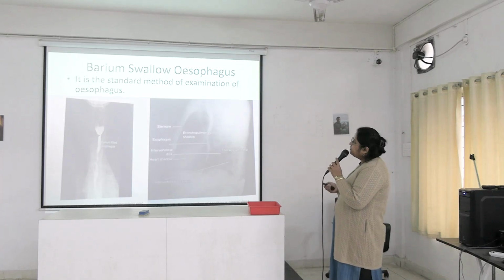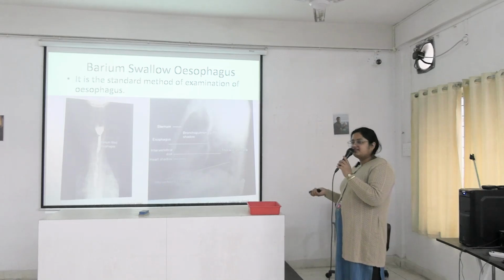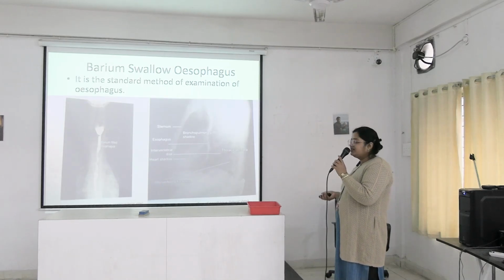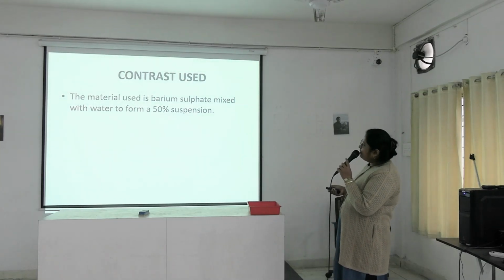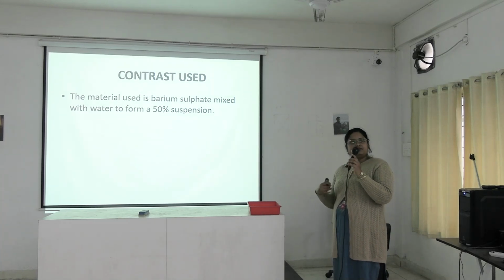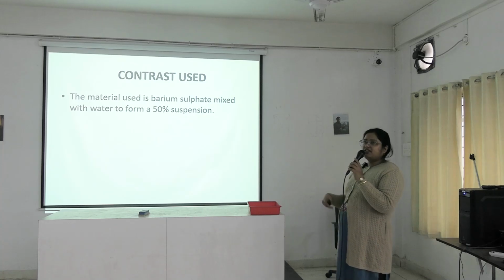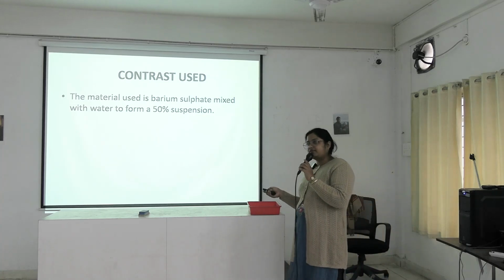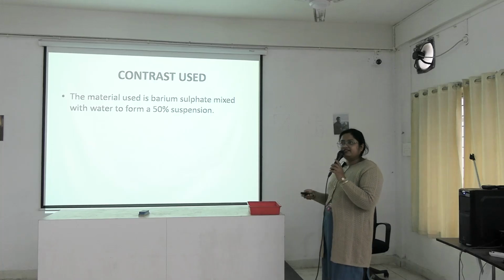Next, in barium swallow X-ray, you can visualize the esophagus in the chest X-ray. Esophagus we will discuss generally during the abdomen barium, and the contrast material used here is barium sulfate mixed with water to form a 50% suspension. The patient is asked to drink the solution and then you will take the X-ray at some intervals, like 1 minute, 3 minutes, 5 minutes. At some interval, you have to take the X-ray. Here, look. The patient drinks this contrast material and then you will take the X-ray.